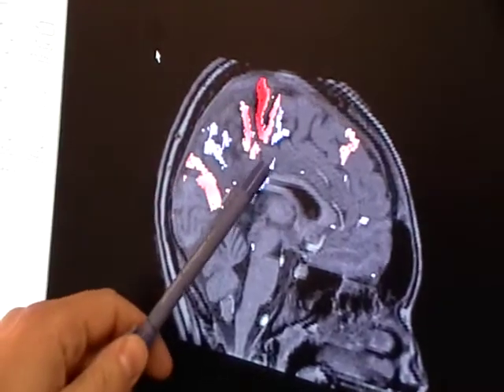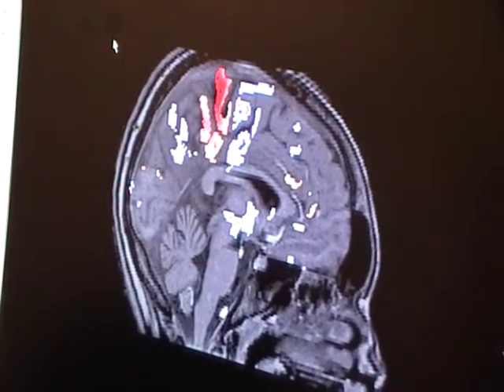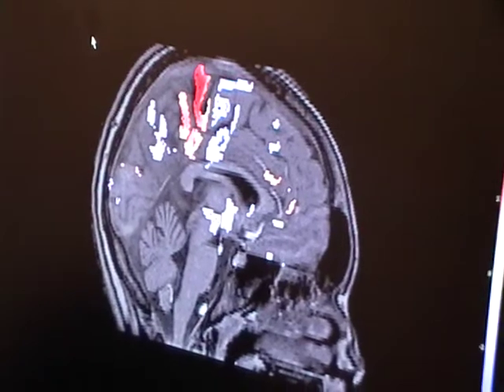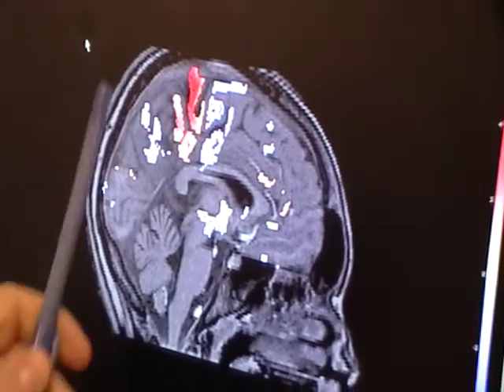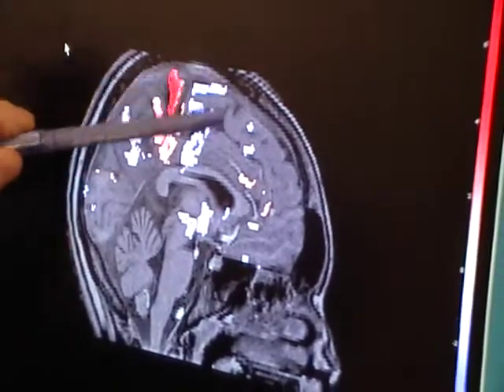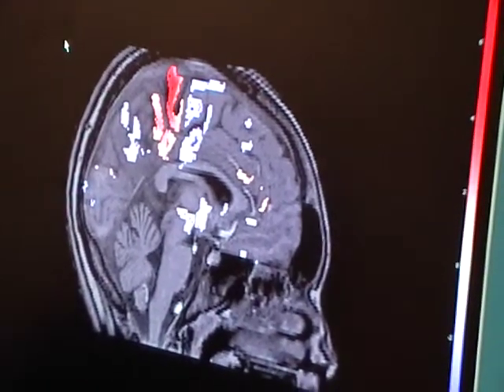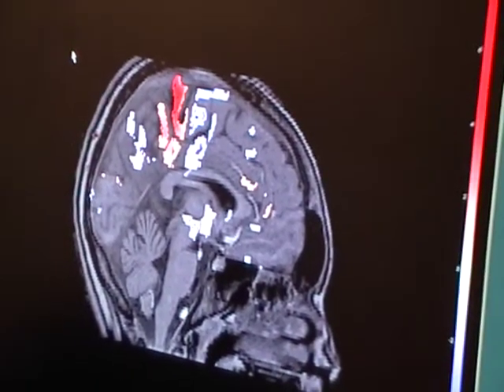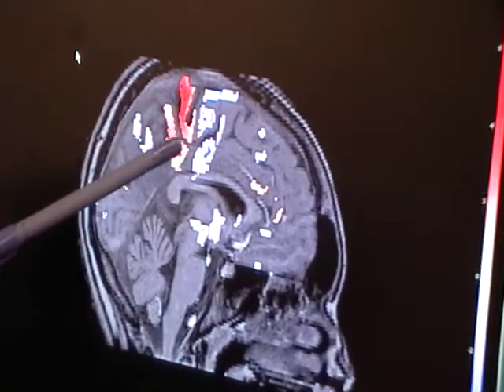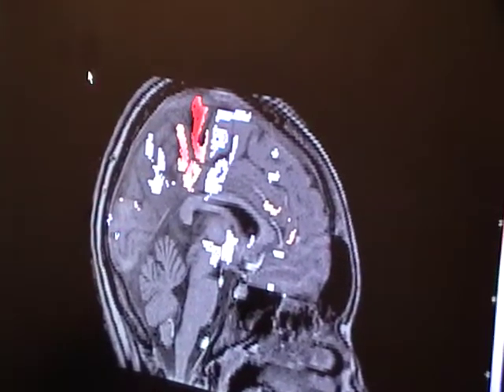And in blue we see some epileptic activity that is competing once again with the normal, healthy brain activity. So basically the test we are doing in our patients is typically this. It's a contrast between the normal brain activity and the epileptic brain activity. Obviously, if these two overlap in the patient's brain, surgery will be extremely difficult to perform, because if this brain area is removed, it's very likely that this patient will lose, in that case, the usage of one hand.